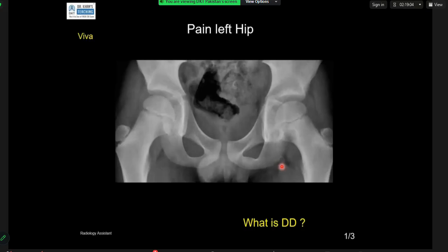The femoral epiphyseal heights are preserved and are not collapsed. So differentials for a lesion with a narrow zone of transition and a sclerotic margin. To me, this looks like a non-aggressive lesion. I would inform the clinicians and gather if there's any systemic upset or fever, but with a narrow zone of transition, I would suspect this may be a non-ossifying fibroma, although I would normally expect it in the tibial metaphysis region, but this is possible.